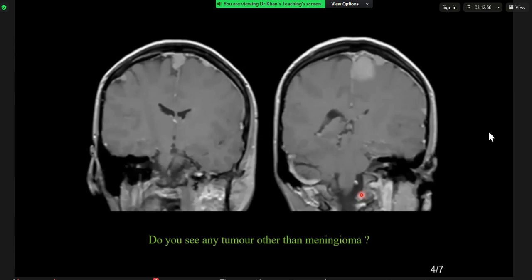temporal region has got hypoattenuation, low signal as compared to the right. So I'm thinking that there appears to be some loss of sulci and gyri at that region as well. So I'm thinking that there might be something at that region in the left temporal region.